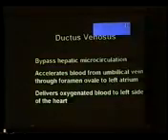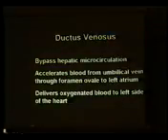Ductus venosus bypasses hepatic circulation, accelerates the blood from the umbilical vein to the foramen ovale to the left atrium. That's the purpose of it, and it delivers the oxygenated blood to the left side of the heart. So here we have already described this point. This is the heart, and we were making the dotted line on this one to tell you that the flap of the tricuspid is 1 millimeter below the flap of the mitral, and if you just draw a line, above and below would be giving you that information.